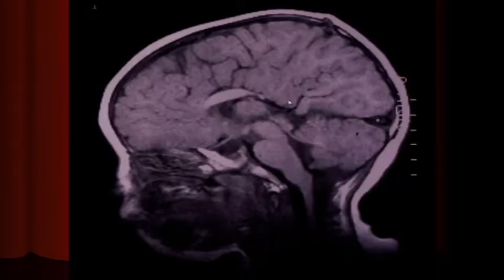Here's the MRI, the T1 weighted image, and it's increased signal because it's fat, and it's right in the corpus callosum. Here is partial agenesis of the corpus callosum. You see how there's nothing here. Do you know, guys, the seniors that are going to take it, what is this structure? That's the tectum, the tectal plate, or the quadrigeminal plate. What is this black thing? That black area is the aqueduct of Sylvius.